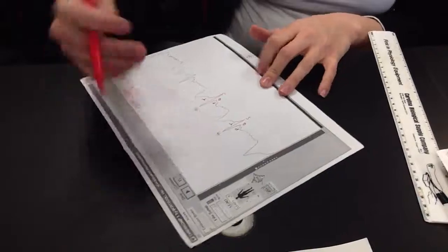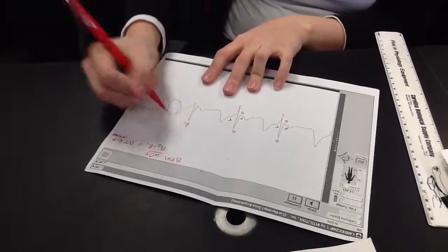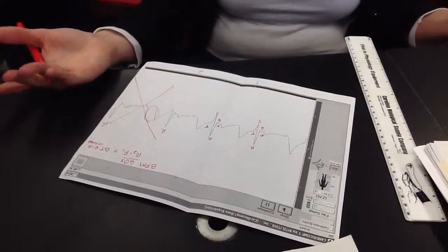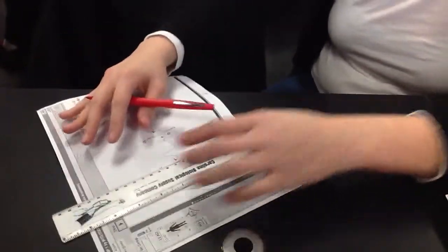So that means you're looking at your R intervals, right? So we have an R. Now this one's going to be a mess because there's a pause there. This one's actually going to be off, so we're just going to ignore this, because anytime you see a pause there, it's going to throw off your beats per minute. Okay, so we're going to look at these three. So what you're going to do then is go over here.